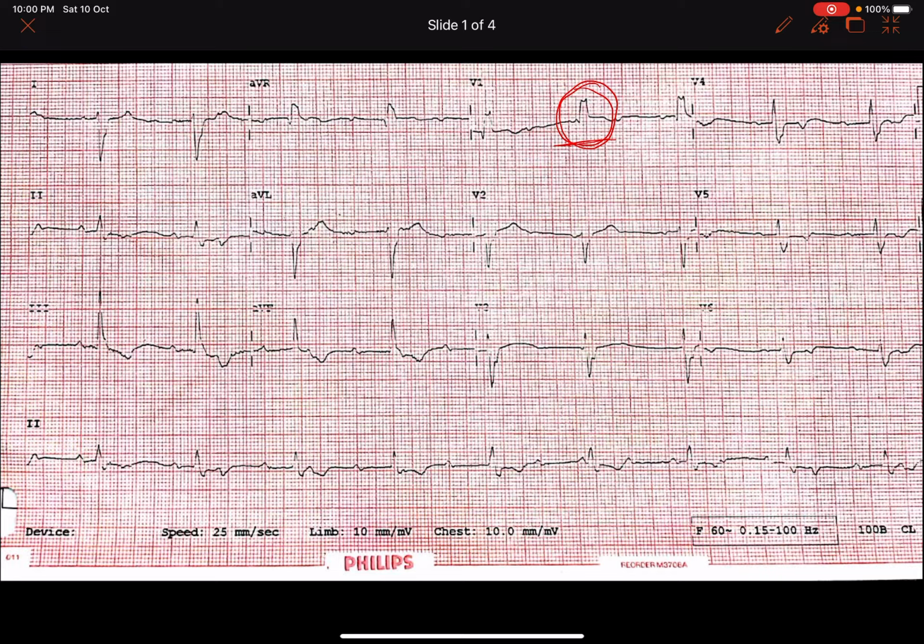So whenever you see such an ECG next time, you should never get confused whether it's a complete heart block or some Mobitz type. See, the management completely differs. If it's a Mobitz type 1 block, the management is totally different, and you can just manage it medically by stopping beta blockers or other medication. But if it is a complete heart block, you should do immediate temporary pacing. So recognizing a complete heart block is very important.